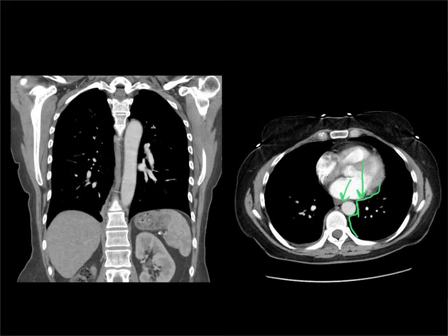So when's this line going to become abnormal? Well, it's going to become abnormal if you have anything up against the aorta that distorts that line. So you might have a mass, e.g. adenopathy, perhaps you have blood, as in the next case I'm going to show you where there's a ruptured aorta, but also anything that involves the left lower lobe of the lung or the left part of the lower hemithorax is going to lose that line.